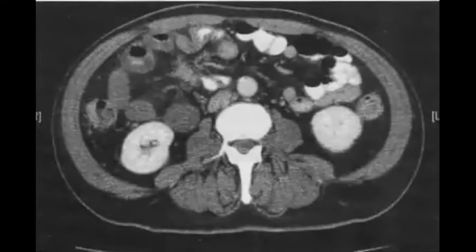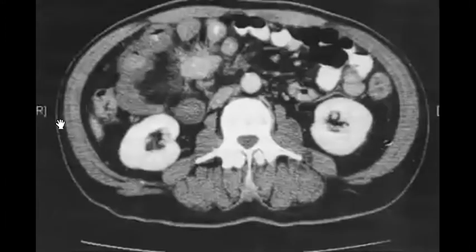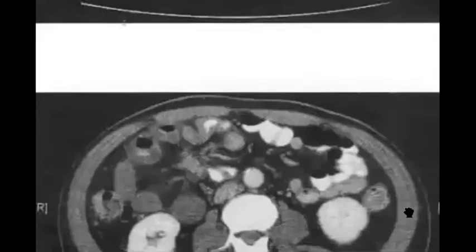And finally, you are required to look for the arterial phase, yes, for the hypervascular lesion. You remember when we talked about the carcinoid as one of the typical neuroendocrine tumors, you check for hypervascular metastasis in the liver. Perfect, Marwa. Perfect, Nermeen. Yes. So when you look for this, it is important for your checklist in the exam.